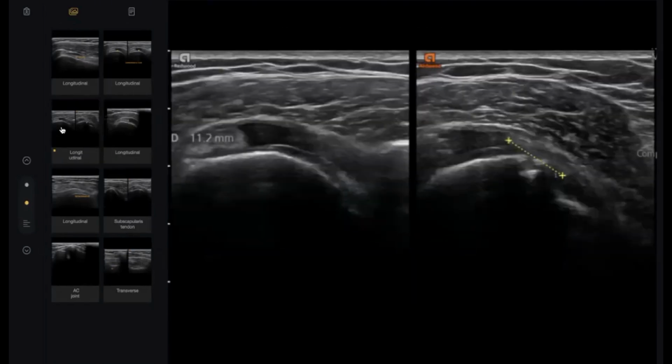If I am the examiner, I will ask you only this question. If you know, I will give you a good mark. If you didn't know, I will fail you, I won't pass you at all. Why? Because supraspinatus ultrasound is all or none. Either you find a gap or not. Nothing else. This gap is filled with fluid.